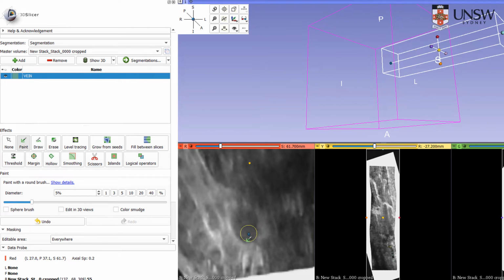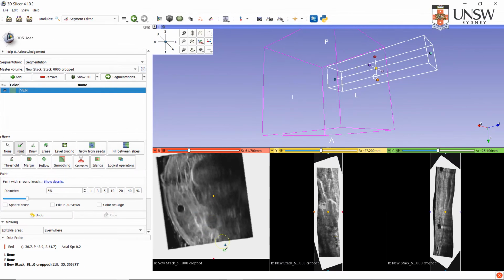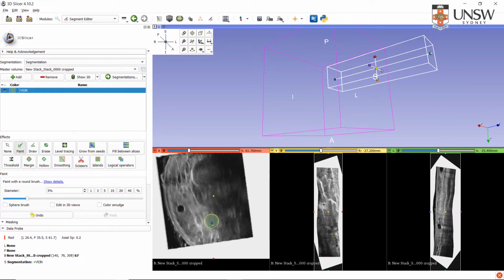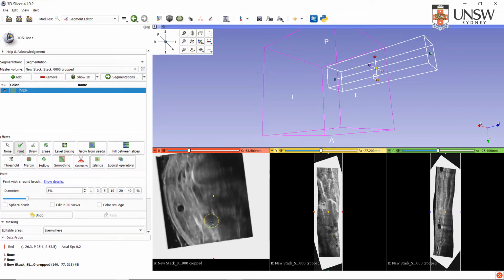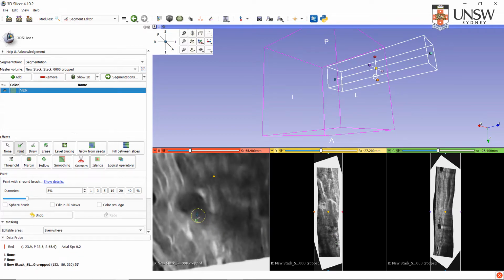So now if you look at this image, that's quite mushy here, you can't really see what's going on. But this tool view will help you see what's going on, right? So this is basically the connection for the other two arteries. So you will see the full image after we finish the segmentation, but essentially this is the connection bit where you will need to pay more attention. So essentially this will be the one that you will need to capture.